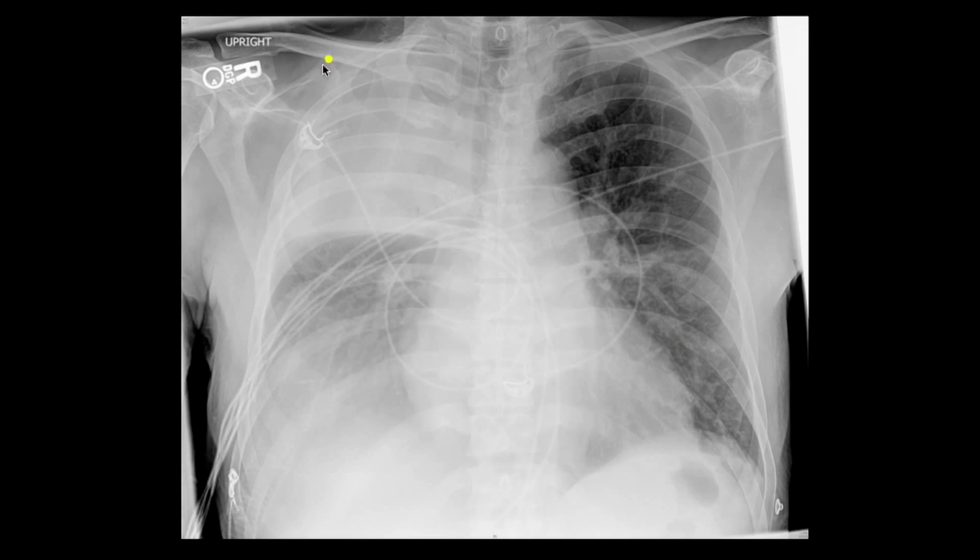In this patient, we've got now opacification of the right upper lung. Again, a suggestion perhaps of these branching linear structures here compatible with air bronchograms. You've also lost the silhouette of the right base, so they may well have some consolidation there, but you see this hazy appearance of the right base, which is usually indicative of layering pleural fluid. So they certainly have an effusion and right upper lobe pneumonia in this case.